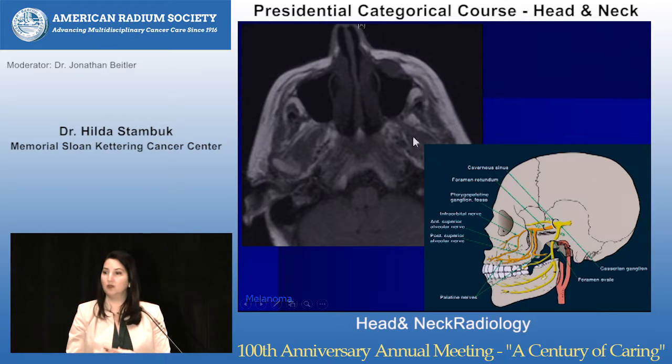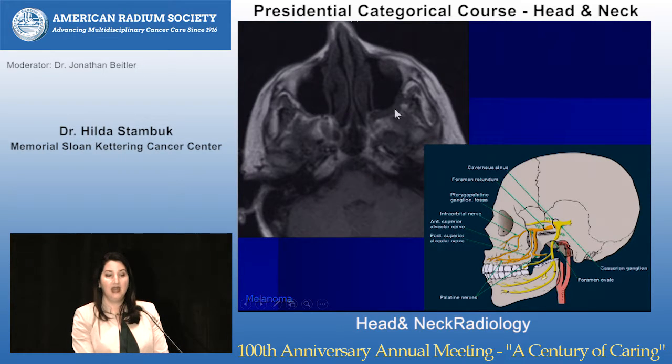And I want to just take you through some perineural spread step by step and why I look where I look for things. Here's an MRI pre-contrast T1 in front of the maxillary sinus right here. In the premaxillary soft tissues, you can see a person that has melanoma. And since this melanoma is right next to the infraorbital nerve, I'm expecting them to have tumor spread along this nerve because melanoma loves nerves. Where is it going to go? Along the floor of the orbit and then the pterygopalatine fossa behind the maxillary sinus. And look, on the pre-contrast T1 weighted imaging, you can see how the fat makes the tubular enlarged nerve stand out. And look at the opposite side.